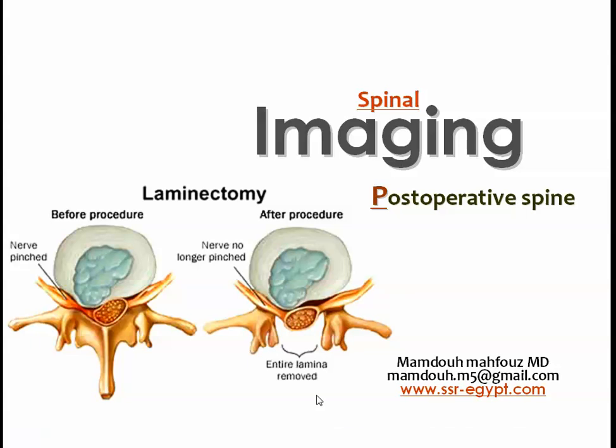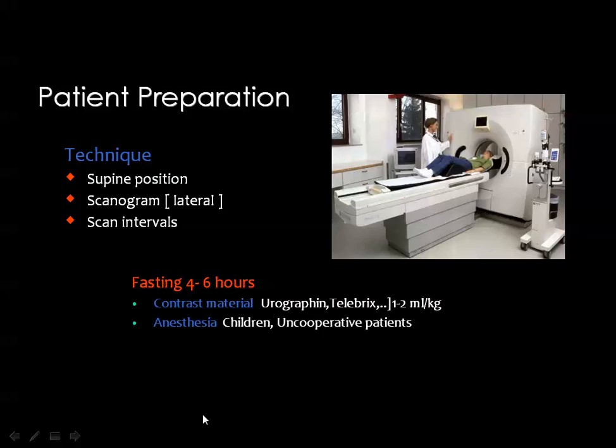Then you know that one of the most common operative interventions in the previous days was this kind of surgery, which is known as spinolaminectomy, where you can remove part of the left lamina and also part of the right lamina together with the spinous process, and you remove this segment so that you can release the posterior aspect of the thecal sac, and then you can decrease the pressure or the mass effect of the disc on the thecal sac as well as on the nerve root.